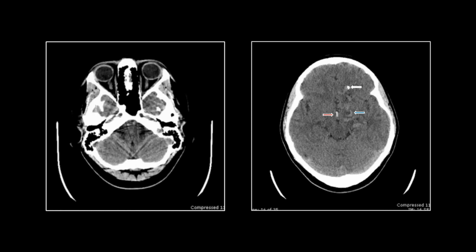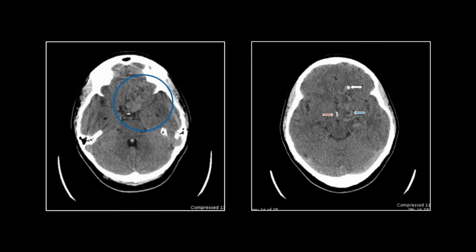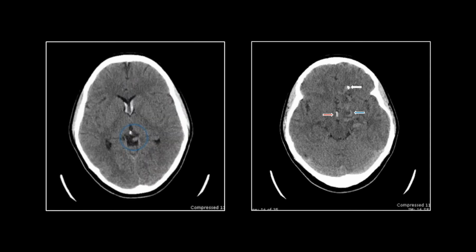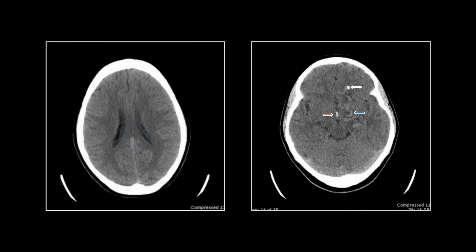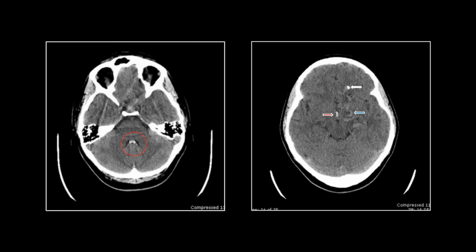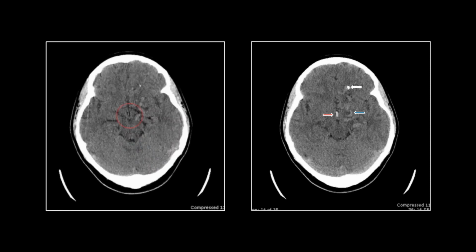That was showing us the intraventricular hemorrhage. We'll start over here. There's the tubular lesion, calcification. There's the basal vein of Rosenthal, which is draining it all. And then the intraventricular hemorrhage.